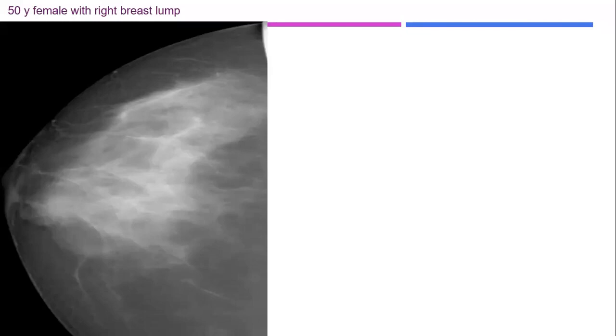Partially obscured mass, I give it BIRADS 4B. Okay. So why do you give BIRADS 4B? Excellent, well done. Though partially obscured, usually we give BIRADS 3. But why have you given BIRADS 4B? It is obscured with the associated ductal extension towards the nipple. Excellent. Yes, these associations. What else?